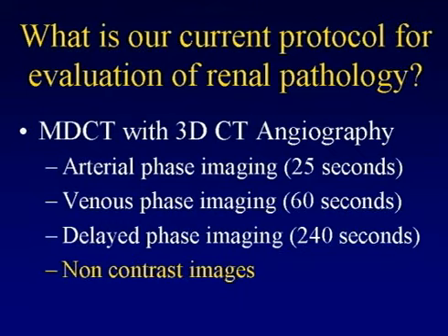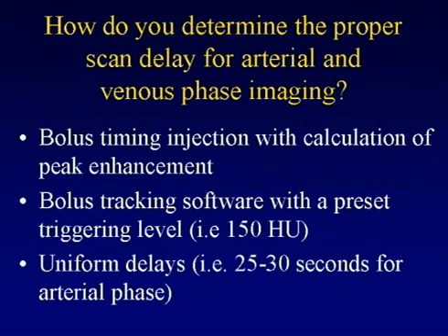I think the issue is these days we see so many high-density renal cysts, typically cysts in the range of 50 to 90 Hounsfield units. And the way to make that diagnosis 100% is knowing that on non-contrast CT, early and late phase imaging, the lesion does not change. It measures 50 Hounsfield units at every point in time. So non-contrast is very critical to get our bearings, to understand specifically what the original density is, and then we'll select the other phases depending on the situation.